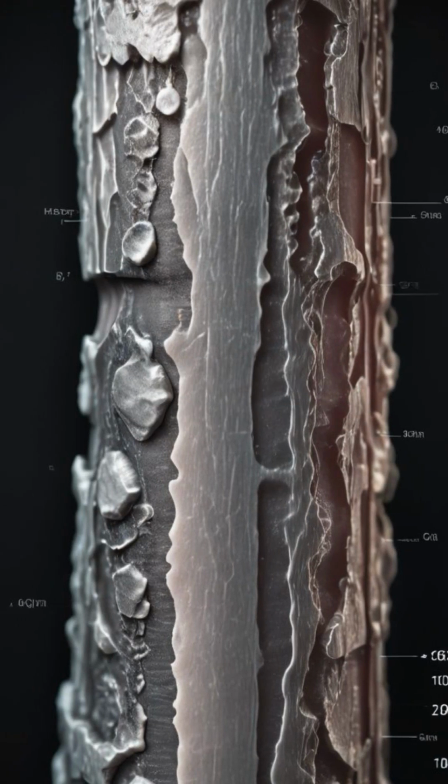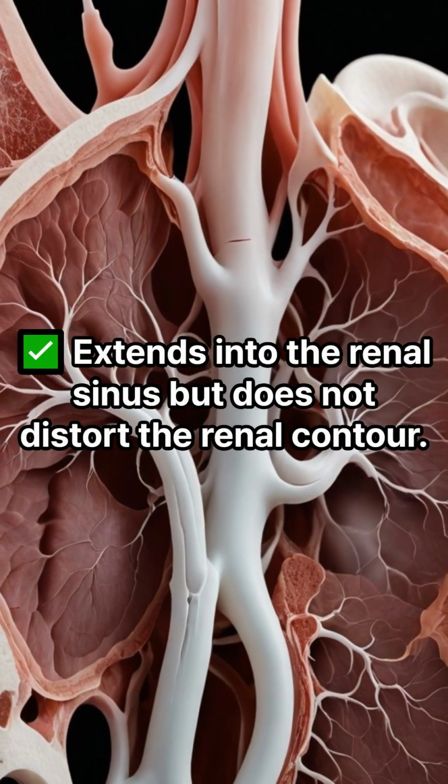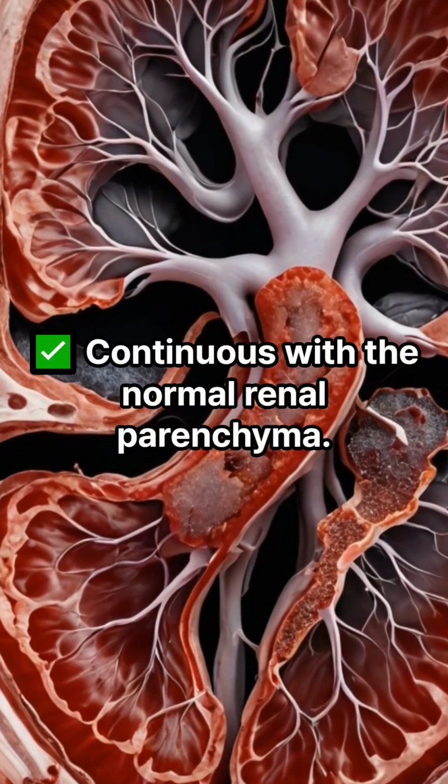Sonographic appearance. Isoechoic to cortex. Extends into the renal sinus but does not distort the renal contour. Continuous with the normal renal parenchyma.